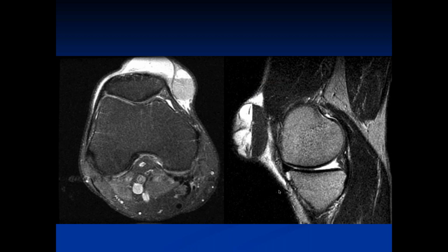So axial and sagittal MR images of the knee, the axial images of PD fat saturated sequence, and there's a hyperintense lesion within the subcutaneous soft tissues, and it drapes over the patella. Then on the sagittal T2 image, there's a fluid level within it with dense material layering dependently. So if in the setting of trauma, it could have been maybe a Morel-Lavallée type lesion or a hematoma.